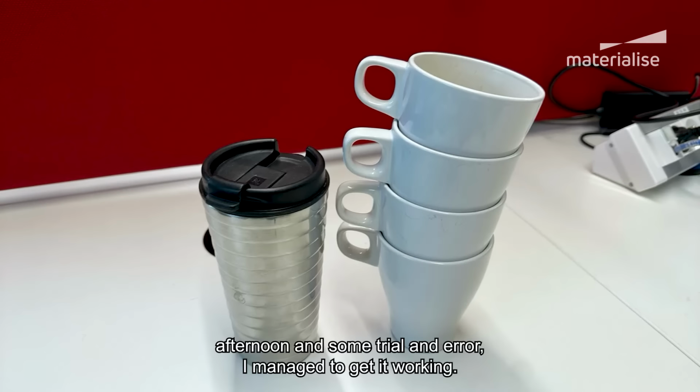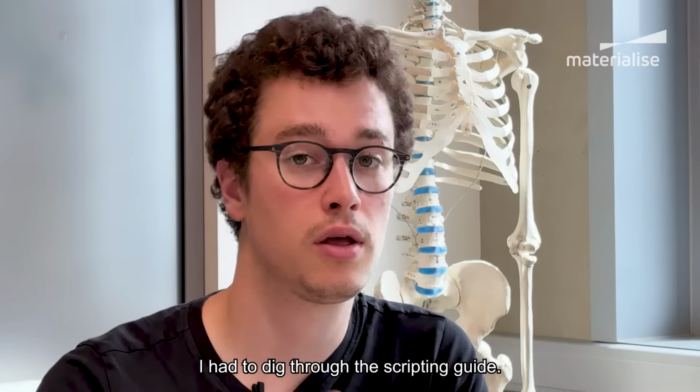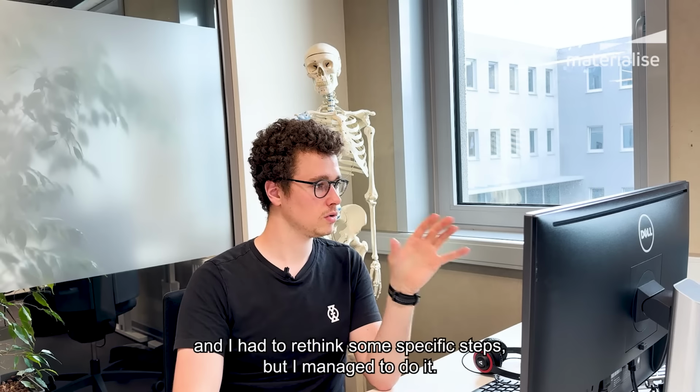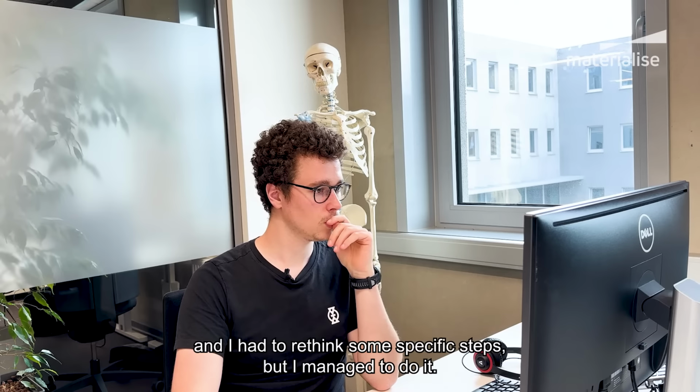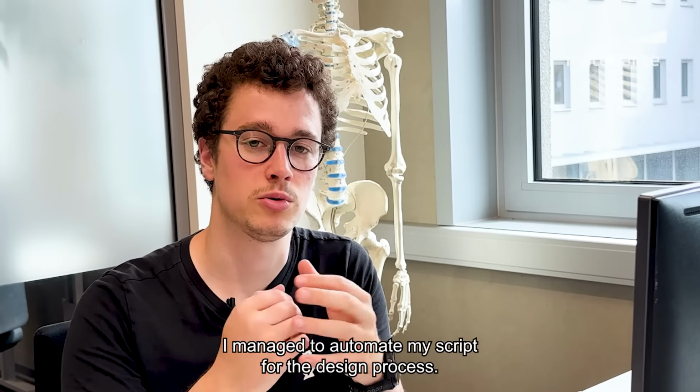After a dedicated afternoon and some trial and error, I managed to get it working. I had to dig through the scripting guide, look at some example scripts, and rethink some specific steps, but I managed to do it. I managed to automate my script for the design process.